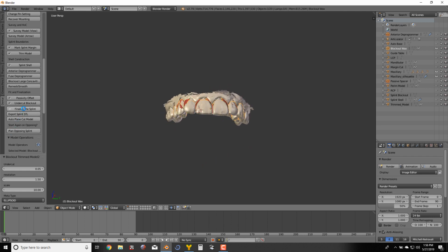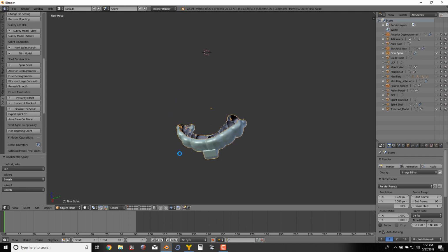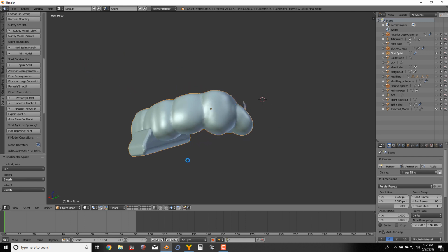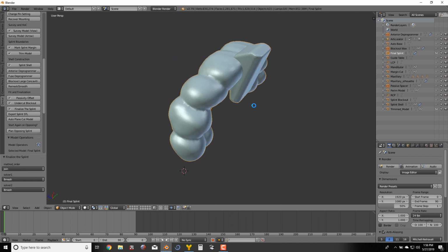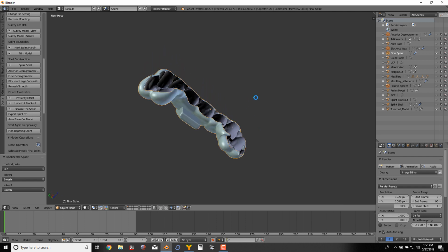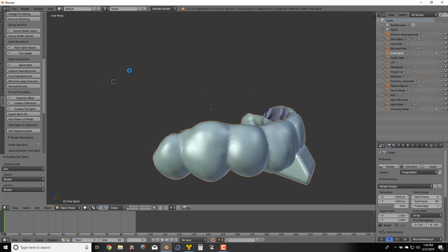So, all right, there we go. We're going to finalize the splint. And there we go. So that is our splint there. You can see a little tag right here. I'm going to clean that up, same thing here. I want to clean that up in Mesh Mixer.